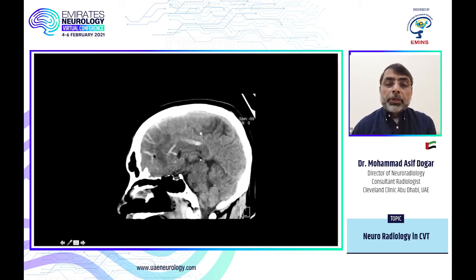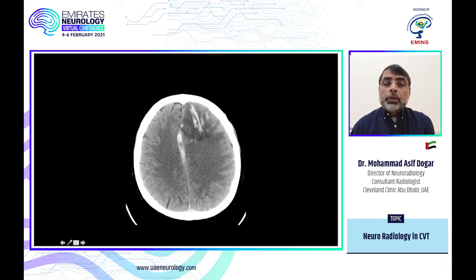Here again, you can see multiple. So these are not the cortical veins on the convexity. These are the veins along the medial surface and they are draining into this area here. If you go inferiorly, you can see this hyperdensity, which looks like a subdural hemorrhage. Only thing, it is tubular and it is only on one image. So this is very concerning for venous sinus thrombosis.